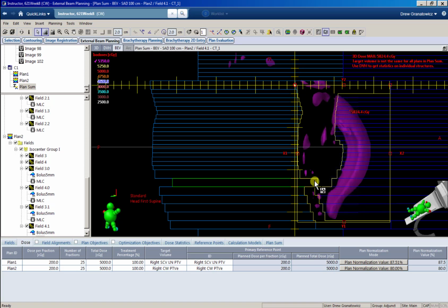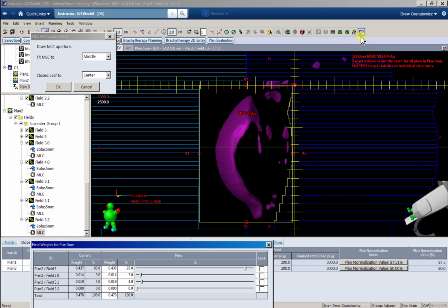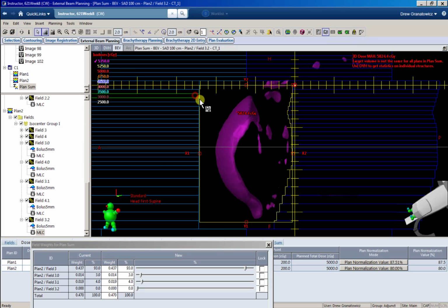So we have these spots kind of showing up immediately. I know that calculation's kind of rounding monitor units. So the plan's actually heated up a little bit, but that's okay. We're gonna adjust our normalization at the end, it'll kind of get rid of all those for us.